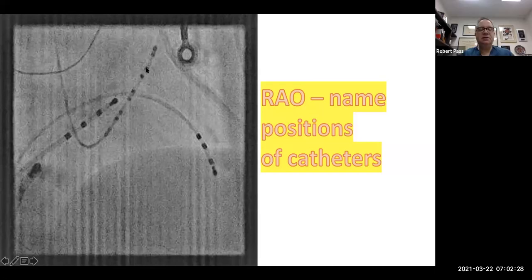Right, so it has 10 electrodes for 5 pairs, a so-called decapolar catheter. In this particular example, it is placed from above, presumably from the right IJ, but it could also be placed with a deflectable catheter from the groin. Dr. Love will often use an octopolar catheter for this, but bottom line is a multiple electrode catheter that goes in the coronary sinus.